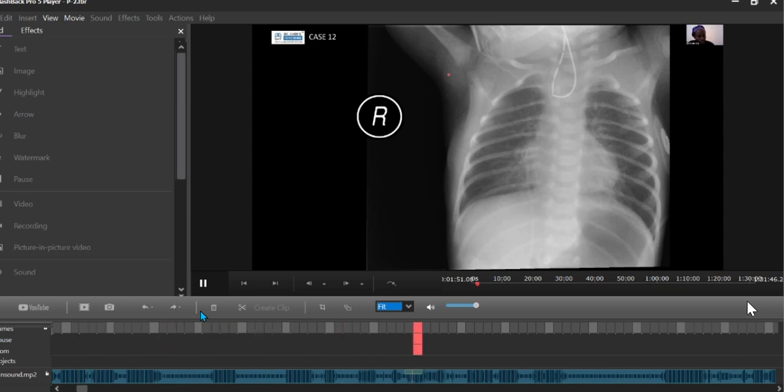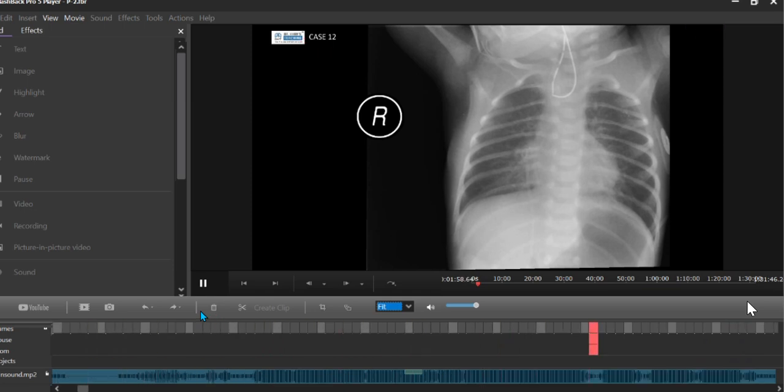So once you identify this on the chest radiograph, what else would you be looking for? So this is a different patient, who also has esophageal atresia. Once you've made this diagnosis on your chest radiograph, what else are you going to assess on the radiograph?